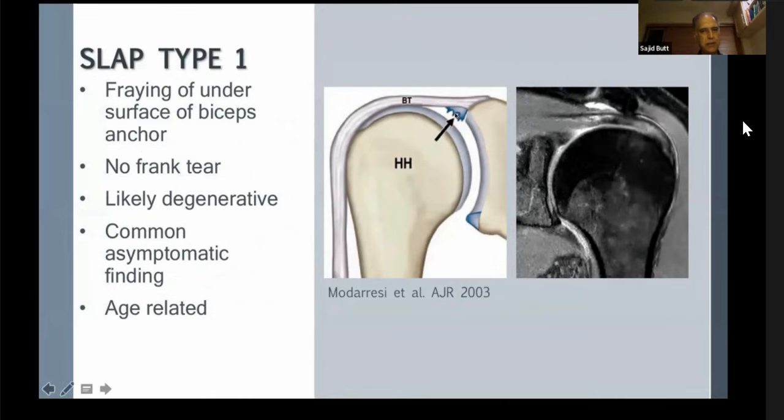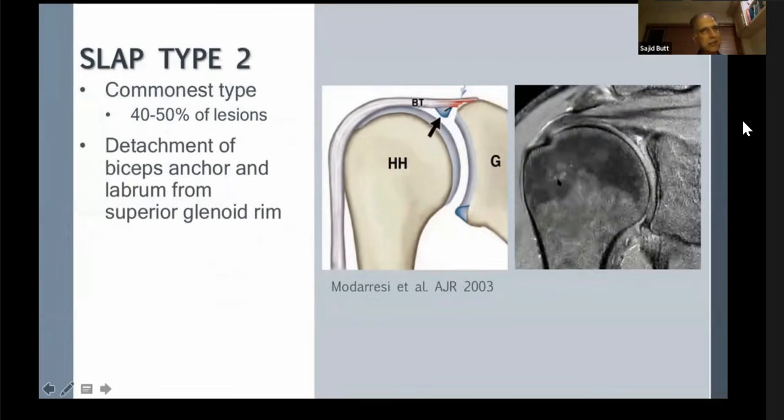So on a schematic, that's what it should look like. In real life, we know that this is not necessarily abnormal. I just told you that this bit of irregularity can be a normal finding, so I won't call it. Leave that, don't call it. Just mention that it's a bit irregular, but I would say that this is a part of a normal appearance.